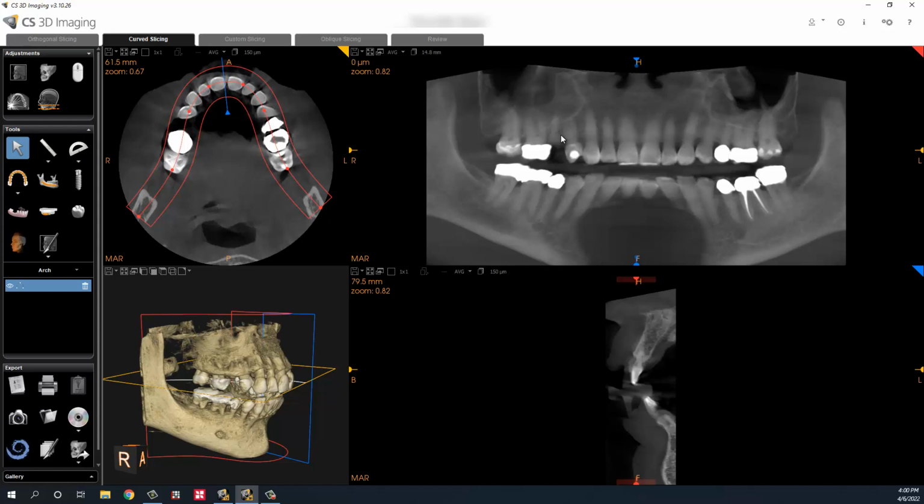But I'm not going to spend too much time talking about case planning for a case like this. I'm really going to kind of pretend it's a really simple case, and maybe I'll have to go back after the fact to customize a little bit for the actual case specifics.